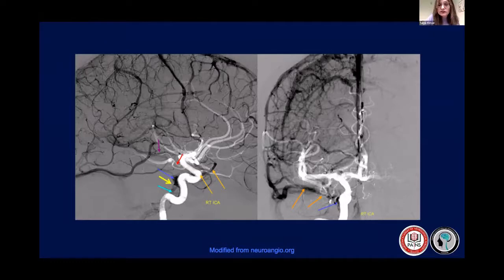And this is the inferior petrosal sinus. This is another one. So, always visualize, because a neurosurgeon can see anything. They can visualize because you see these things in daily life. So, always visualize how the internal carotid artery is running into the cavernous sinus.